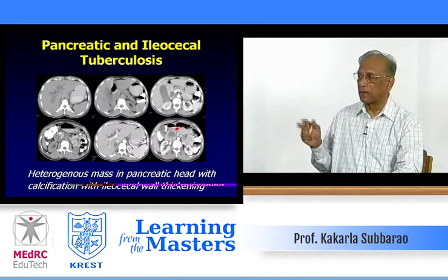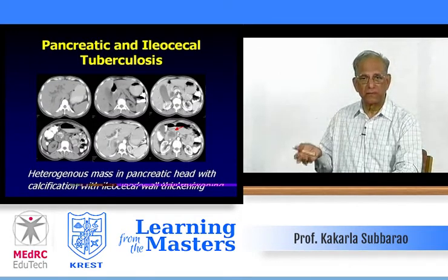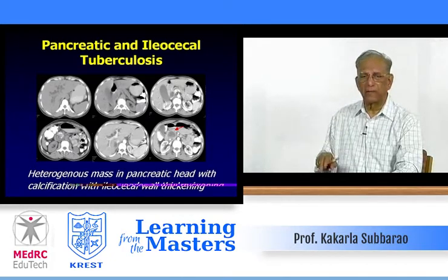Again, pancreatic and ileocecal tuberculosis. As I said earlier, again repeat, it is a systemic disorder. In this particular case, not only the ileocecal region, but also the pancreas is involved.